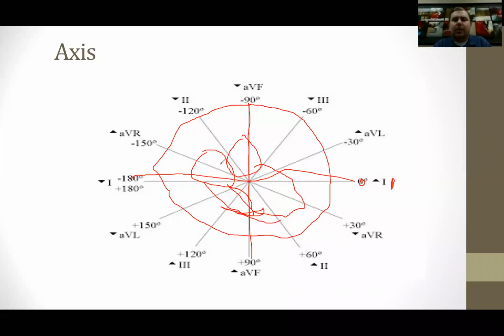Most people end up disregarding aVR from their 12 lead interpretations, mainly because they just haven't been taught what aVR actually means. There's a lot of literature out there that shows that aVR can help determine if the patient is going to need bypass surgery whenever they're having a STEMI.